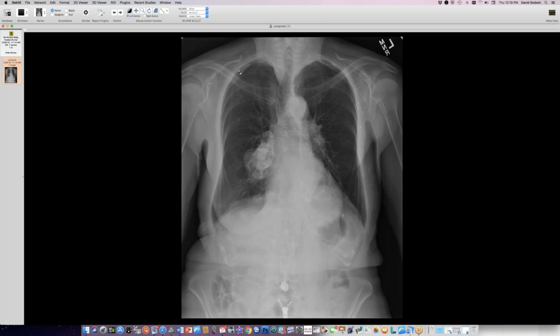I think when the lung has been hanging there for decades, there's some minor trauma to the pleura. I'm just kind of rationalizing this, and then I've seen calcifications in this thin arc up there. There's not really any thickening, but I think it's fairly ischemic up there, and there's traction on it all the time, and I think it just degenerates and calcifies. So that's my rationalization for this finding. I've seen it mostly in old people.